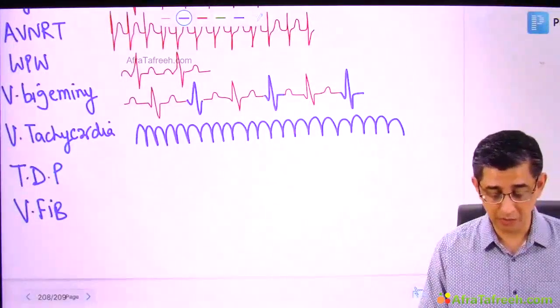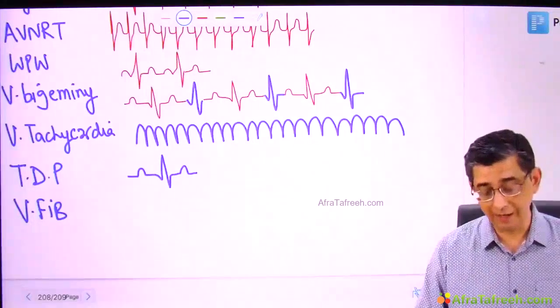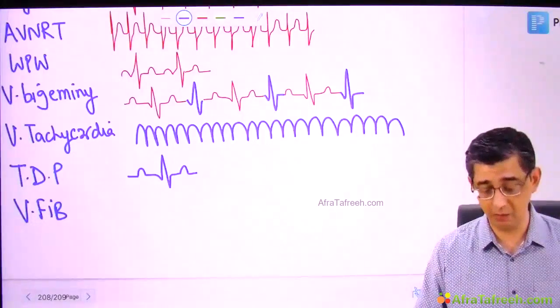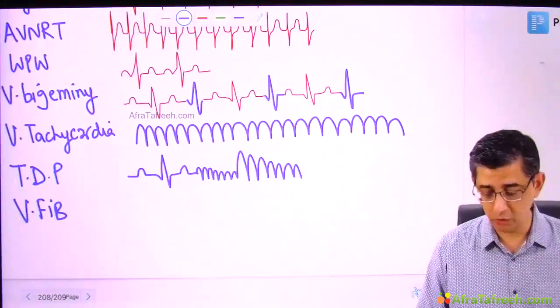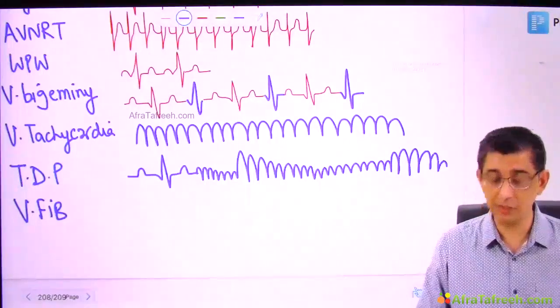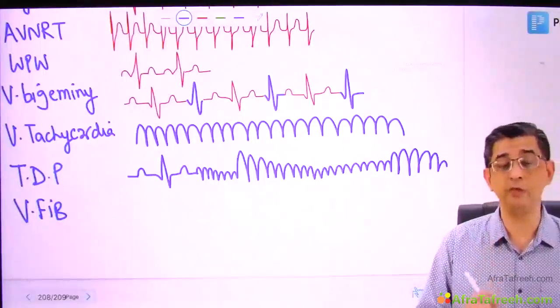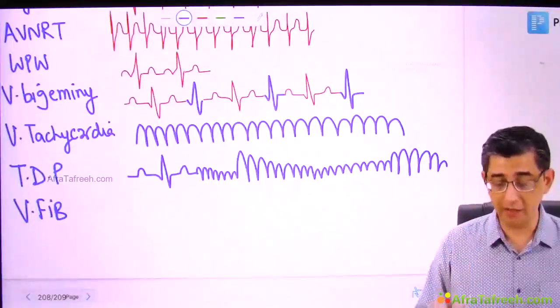And when it comes to Torsades de Pointes, then I'll just draw baseline rhythm, and once any electrolyte imbalance, hypokalemia, hypocalcemia, hypomagnesemia would start, you will notice that the sinusoidal pattern will be changing in amplitude. And therefore it's important, because don't mistake this with especially I would say electrical alternans, because in electrical alternans it will be a normal duration QRS whose voltage will be fluctuating, but here it is a broad QRS.